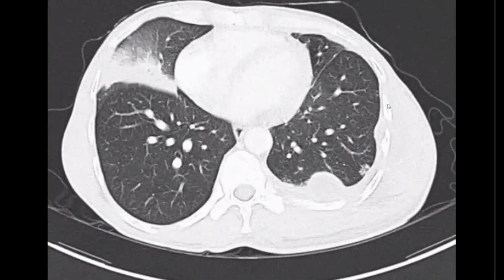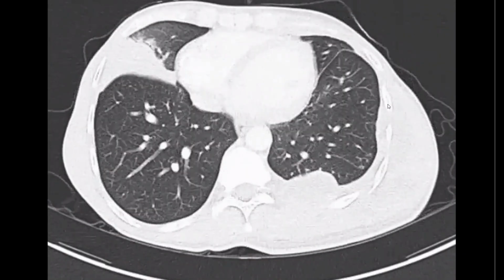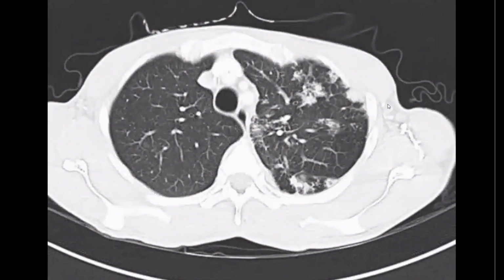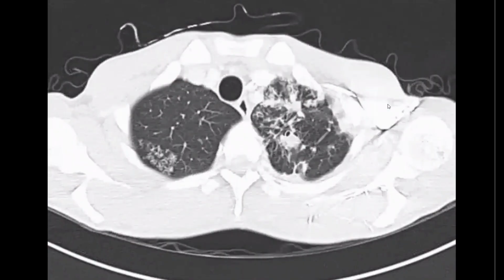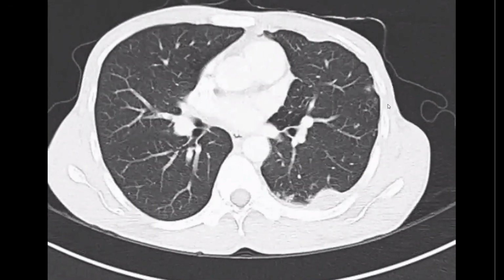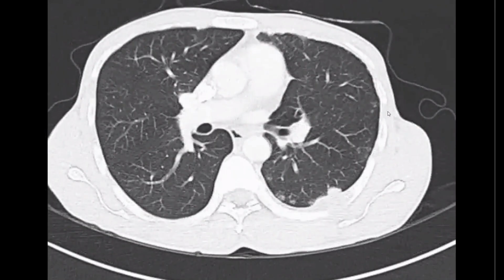The heart and the mediastinum appear normal. On the left side again there is a segmental collapse. So sir, this looks like an infective process with a large abscess formation in the posterior muscles of the back, with left lung infective changes.